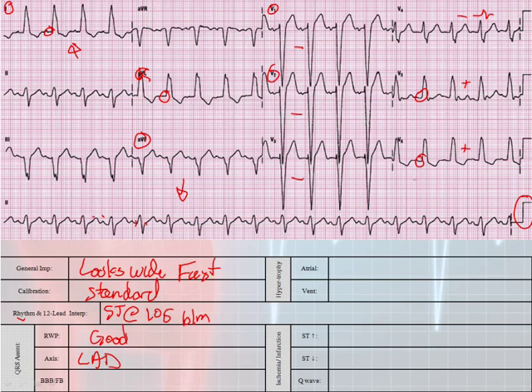And I do not. So I have met all criteria for a left bundle branch block. So let's go ahead and finish interpreting my 12 lead here. I have a sinus tach at 105 beats a minute with a left axis deviation and left bundle branch block.